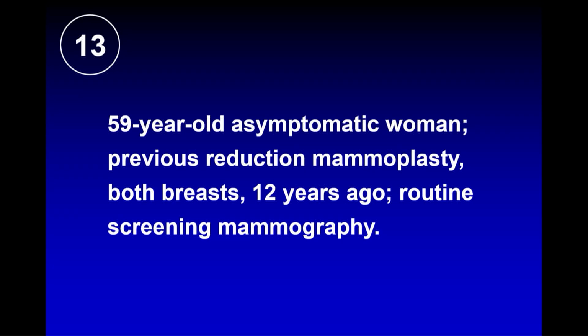I wouldn't use any of those. I would just say there is whatever. I wouldn't try to say things about temporal change, because of what you put in the report. If a lawyer gets involved, and usually they won't, but if a lawyer gets involved, they are going to very carefully read your reports, looking for a little opening where they can.